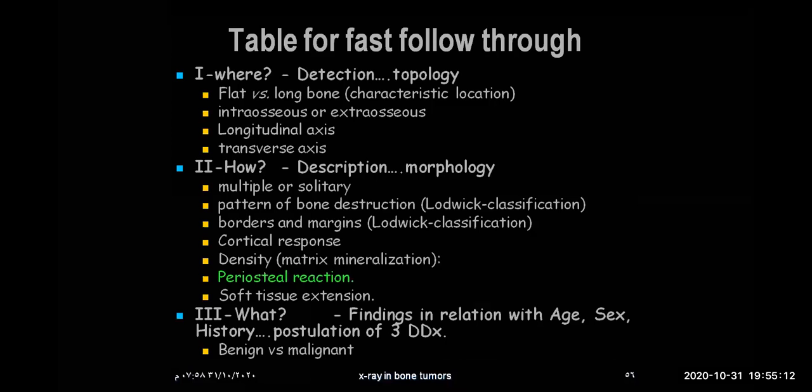Okay, now we go back to the periosteal reaction and soft tissue extension.